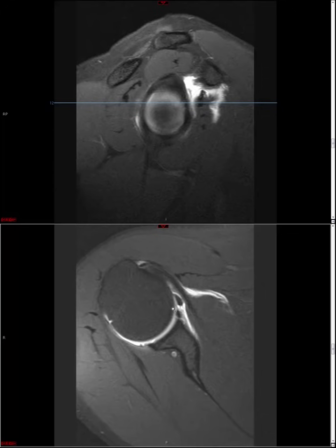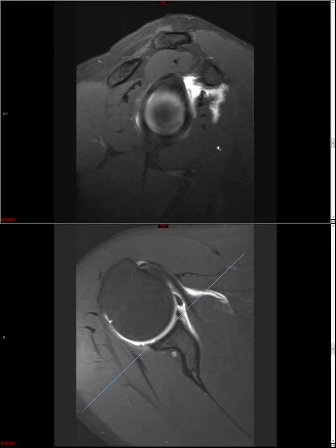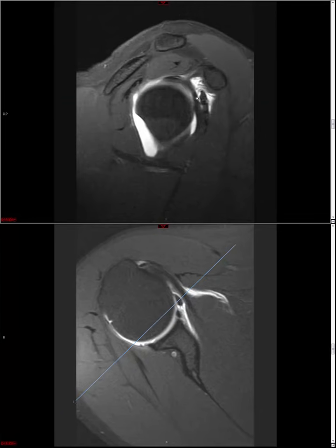If you see no labrum and you see a thick cord-like middle glenohumeral ligament, that's this guy here, and just to show you where that is, this guy here between subscapularis and glenoid, another great OSCE favorite, then you're actually dealing with a Buford complex, which is also a normal variant.